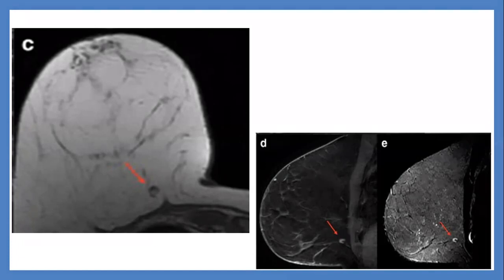So we have to be cautious when evaluating lymph nodes, not depending only on the kinetics. We need to correlate the kinetics with the morphological criteria, because the kinetics can be suspicious, giving an intense peak of contrast uptake with rapid washout. Type 3 is the suspicious or malignant type of curve, okay?